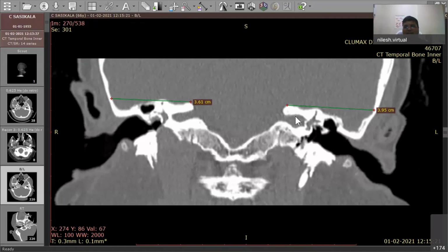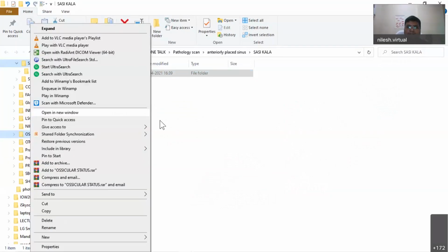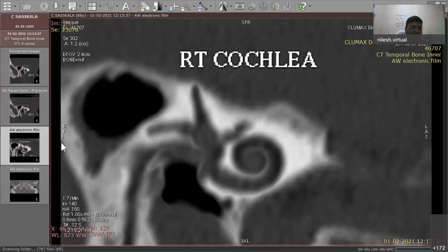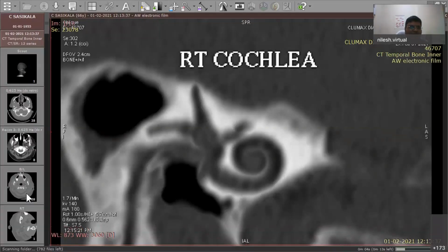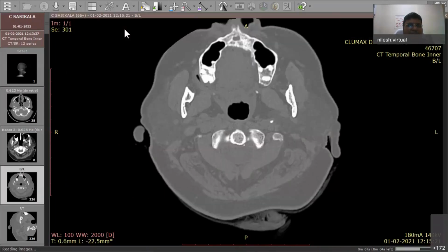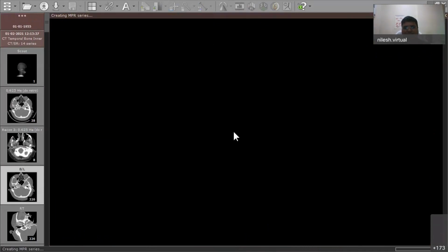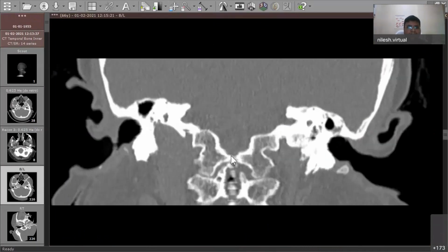How to identify? Again, draw a line all along the petrous bone roughly and try to see how much part is projecting down. So those two were low lying tegmen, and we saw in the beginning, when I was showing you this scan for sigmoid sinus and jugular bulb, see again this coronal, whether the tegmen is low lying or not. This is one we saw already.